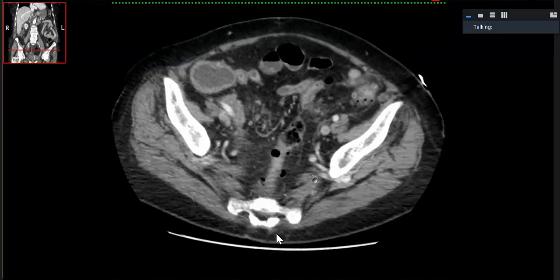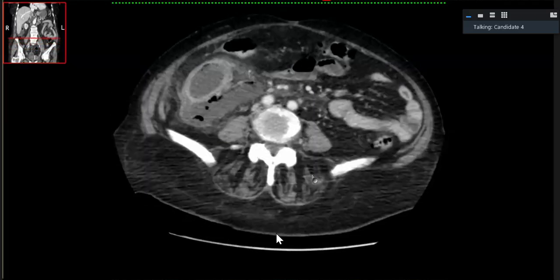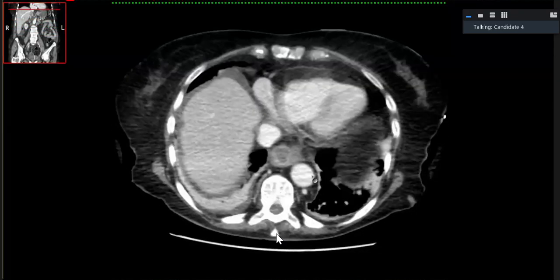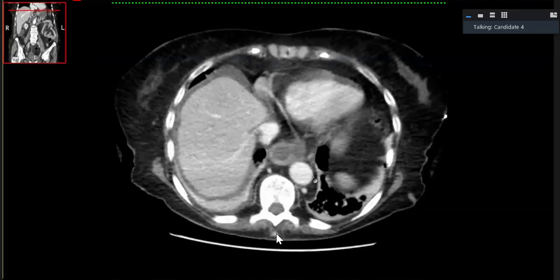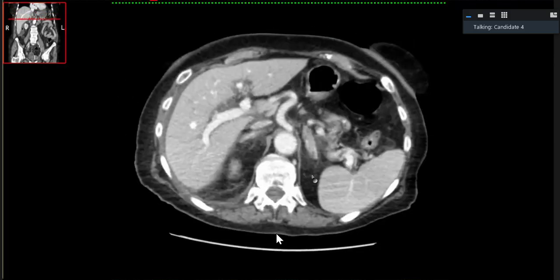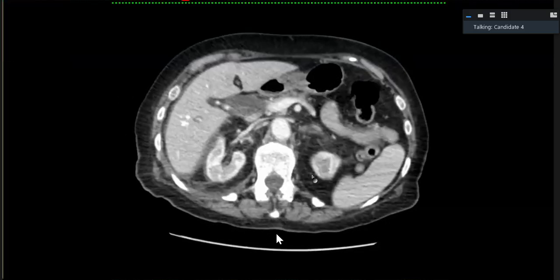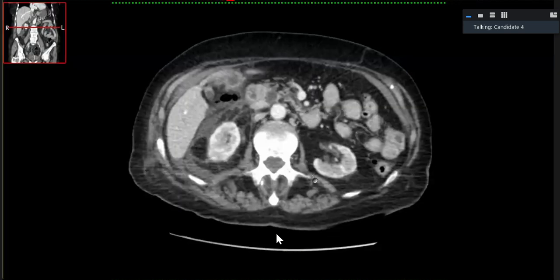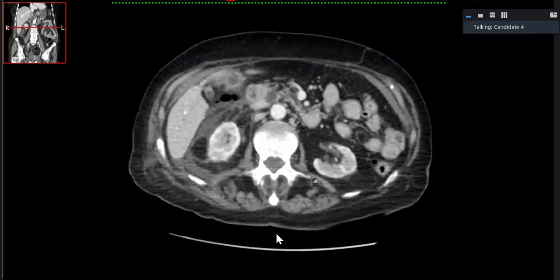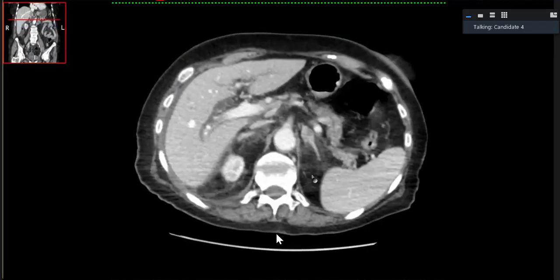So, in the region of interest, I can see there is a bilateral pleural effusion more on the right side with passive basal lung atelectasis. There is an evidence of hiatal hernia and a mild dilatation of intrahepatic biliary channels is seen. The CBD is also dilated till its end. Pancreatic duct is slightly prominent. However, pancreas is markedly atrophic, maybe due to old age of the patient.